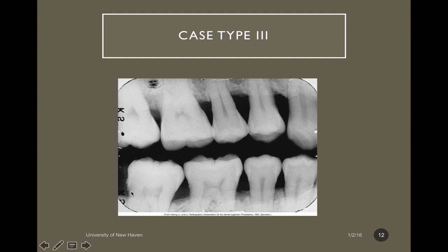If I want to look for the pattern of bone loss, whether it's horizontal or vertical, I'm going to trace my bone levels. Here's my crestal bone, here's my CEJs. I would definitely say that looks pretty parallel, so there's horizontal. Now when I look between 5 and 6, this is why I said it's very important not to just simply eyeball it.